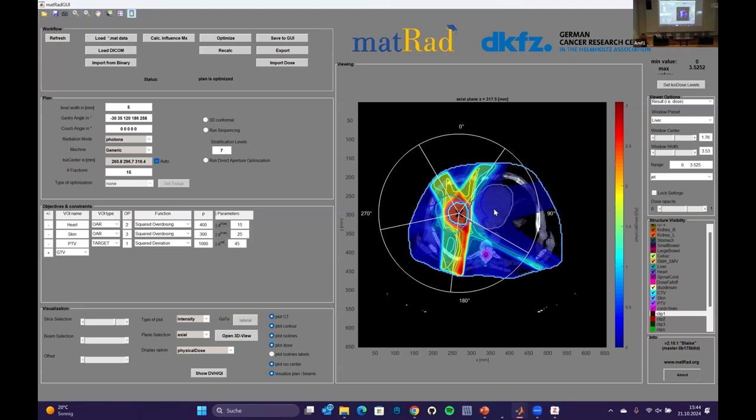Yeah. And I think now you start to understand a little bit why this process can be kind of annoying. I just added one function that I think was a good idea, reduce dose in the heart, but everything you change in the treatment planning workflow, in your priorities or whatsoever, will impact the treatment somewhere else. And finding this is really a little bit of a tedious thing.